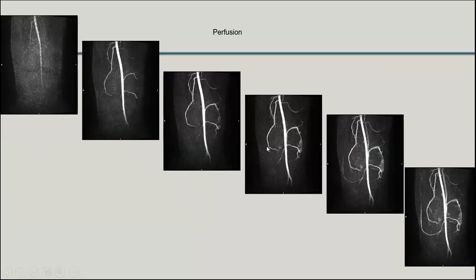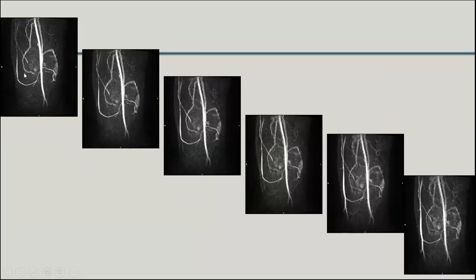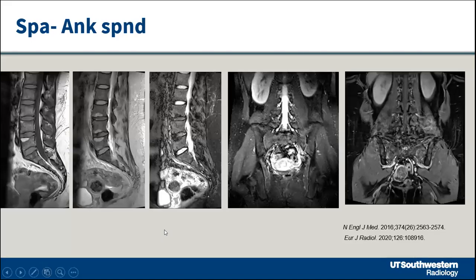So that's one, right? The one we are seeing at the popliteal fossa. That's one in the back. This one. There are more there. 1, 2, 3, 4. So there are so many foci. And as you get to the diffuse stage, here there are so many foci. So there's not just one. So you've got to use these multi-parametric techniques everywhere possible. And these are free if you're giving contrast. You can run your perfusion, you can run your diffusion in 3 minutes and get that.